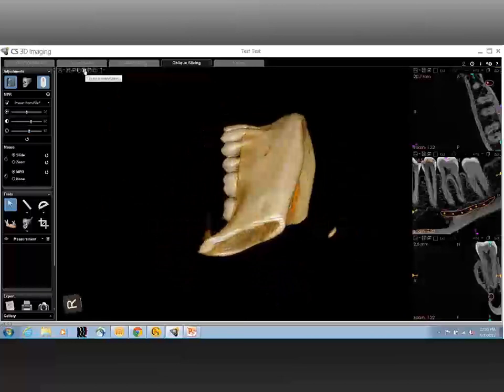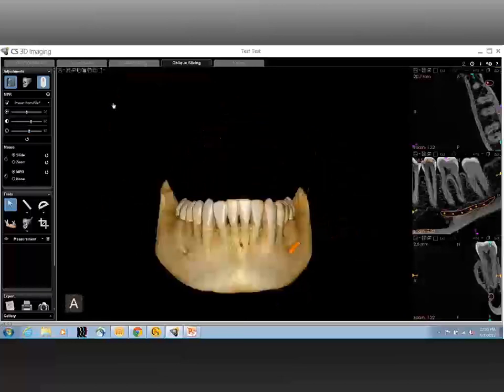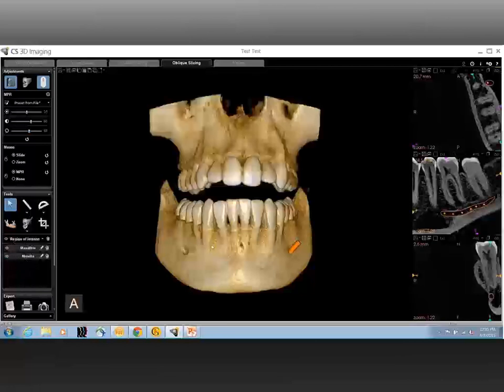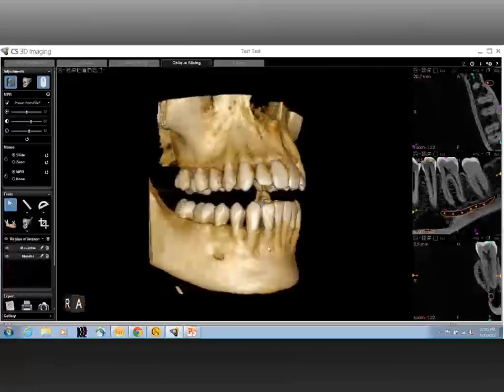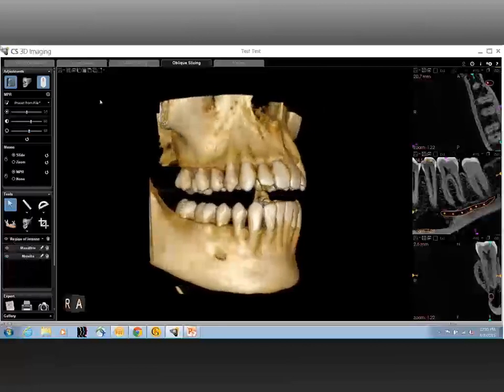And on a more serious note, carotid atheromas: in a slightly larger field of view, where you can capture up to the angle of the mandible and the ascending ramus of the mandible, you would possibly be able to see even carotid atheromas if they are present. It should also be noted that carotid atheromas may be visualized even on a two-dimensional panoramic and not just on a three-dimensional scan.